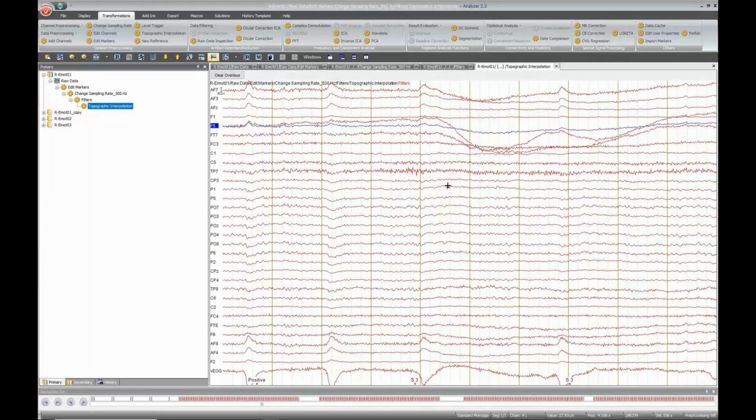All right, now that we have the interpolation, and we have already filtered our data, then we can think about the re-referencing of the data. But for that, let me get back into the slides.